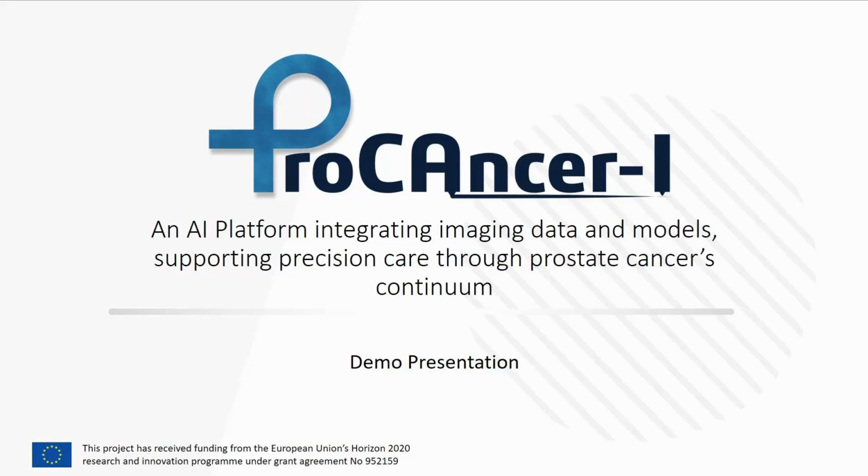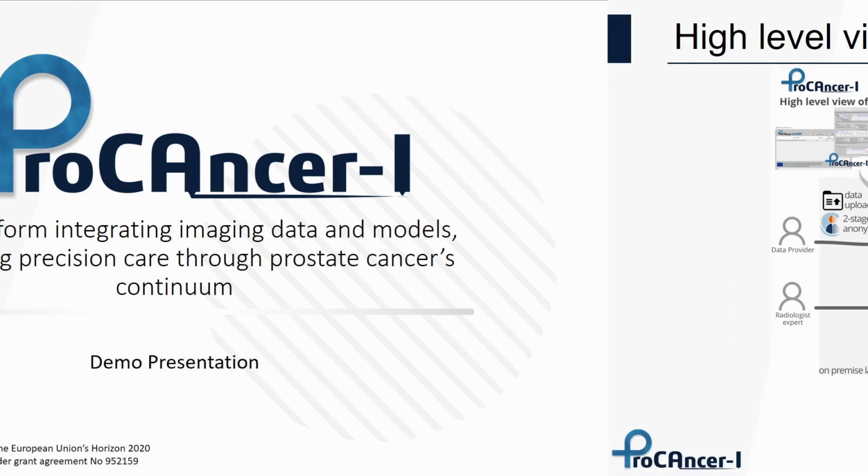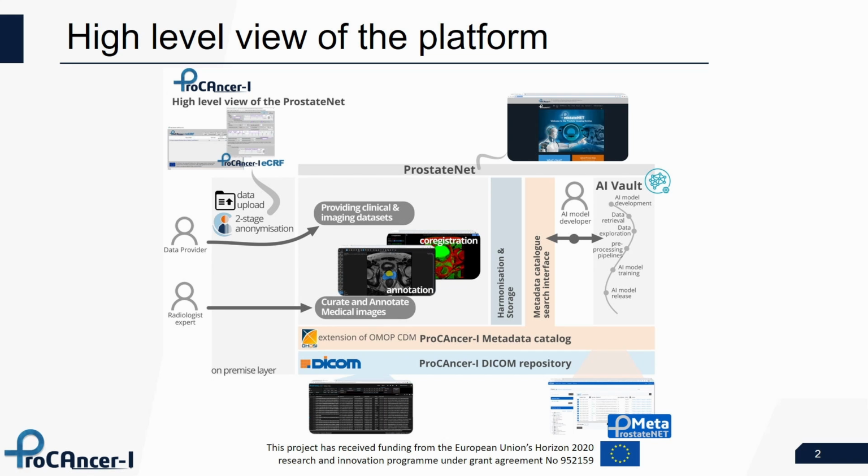The purpose of this video is to guide you through the whole process of uploading, annotating, curating, and preparing the appropriate cohort populations to be used for AI model development. I will start our demo presentation by focusing on the three main domain-specific areas of functionality of the platform.